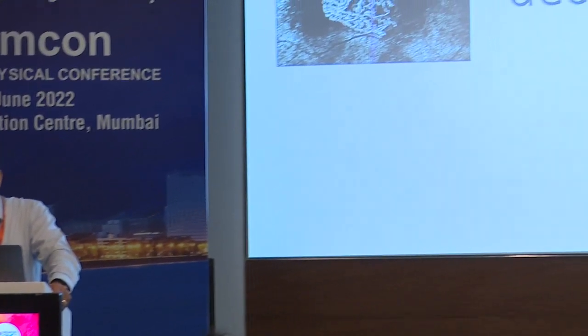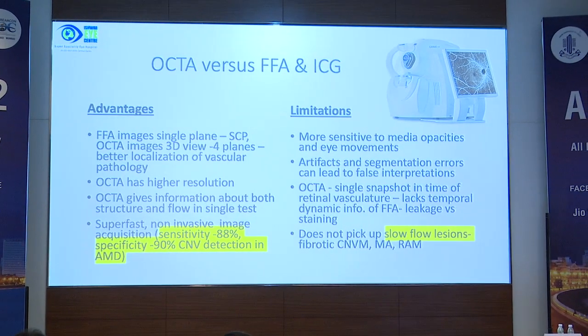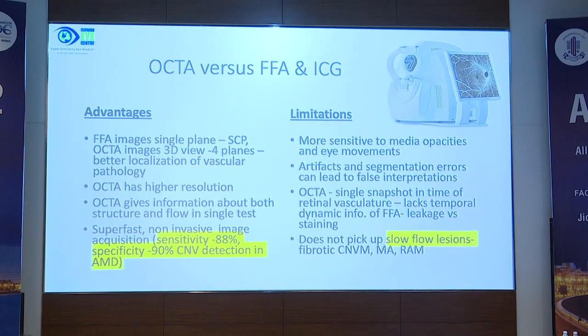Good afternoon, everyone. As a part of the instruction course, I'll try to highlight certain areas where the OCT simplified my decision making, or where it confused me even more. OCTA versus FFA and ICG, the debate rages on.